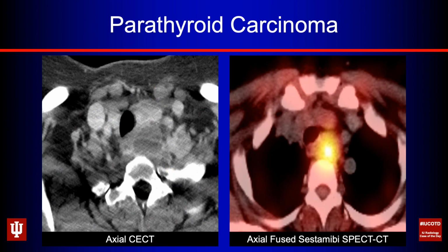Here's another patient with a parathyroid lesion, thought based upon its size and its appearance that this very well could be a parathyroid carcinoma. You can see on CT, sort of low density, kind of has that infiltrating, almost invasive look to it, and it was markedly bright on sestamibi. So this came out, and I thought that the actual path note, which had some caveats to it, really was helpful for my better understanding these tumors.